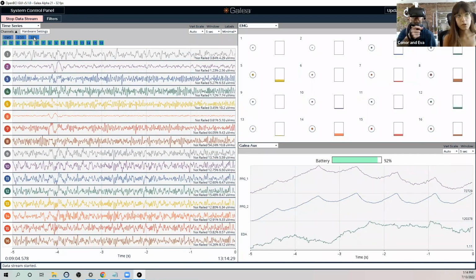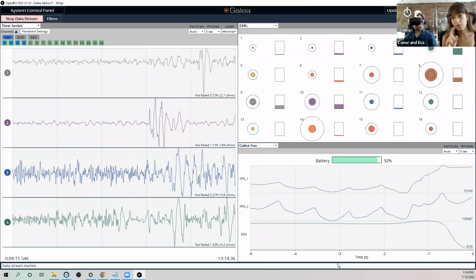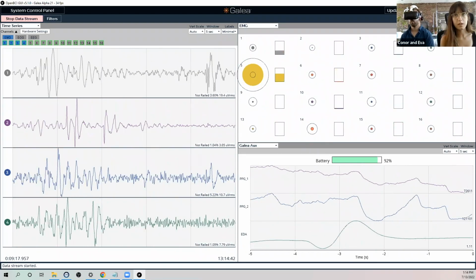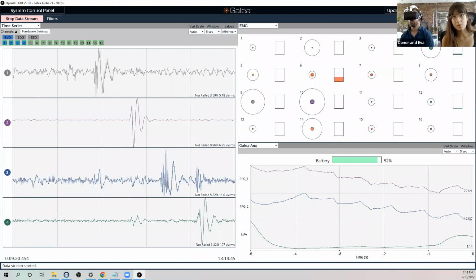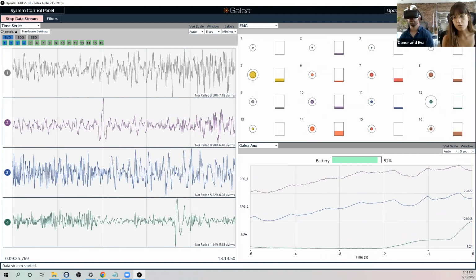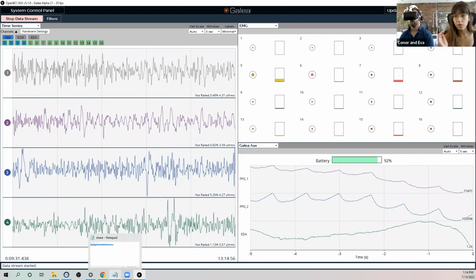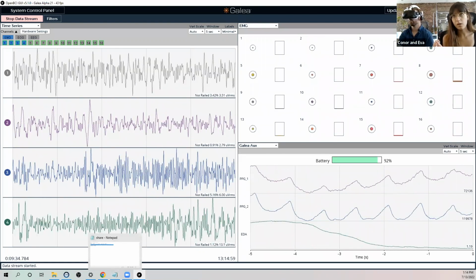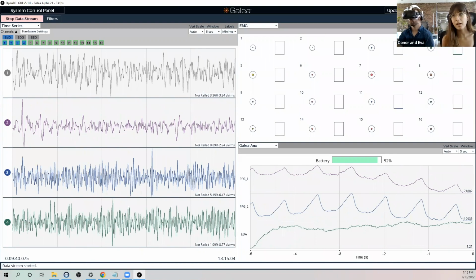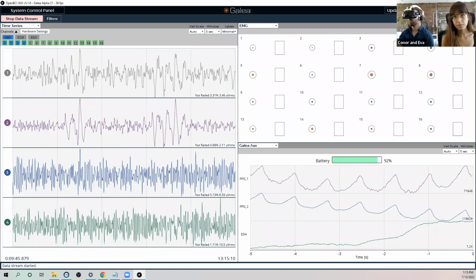So in the time series widget, we have a few buttons at the top where you can select just EMG, EOG, EEG for convenience, but you can also select individual channels that you want to see, or turn them on or off if needed. So Conor just opened the EMG widget on the top right. What this widget does is it gives you a normalized version of the data. And it offers several parameters that you can change, like, for example, the window that you are smoothing the data over, or the limits that you want to see set for your 0 and 1. So right now we have 200 as the max UV limit and 20 as the minimum.